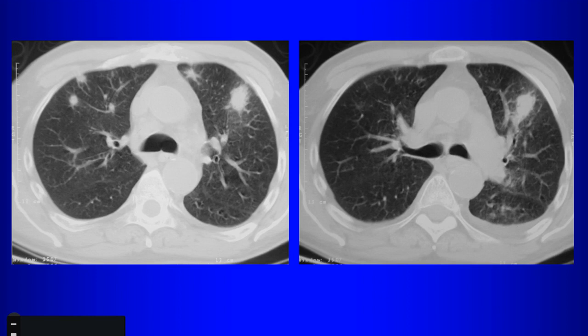Invasive. What would you ask about the patient? Immunocompromised? Yes. What particular problem? Neutropenia, yeah. So you would ask if the patient's immunocompromised, is the patient neutropenic? So certainly invasive aspergillosis, right? You can have other lesions also that might give you ground glass halos, like what? Pneumatoceles. But it wouldn't look like that. Wait, what did you say? I said pneumatoceles gives you ground glass.